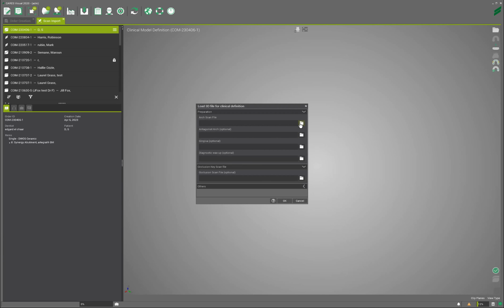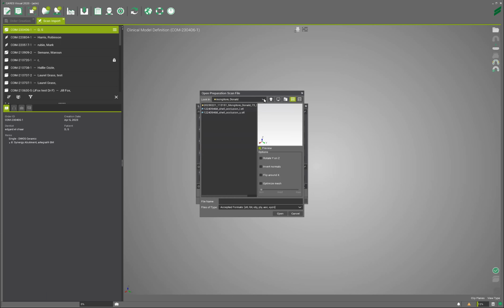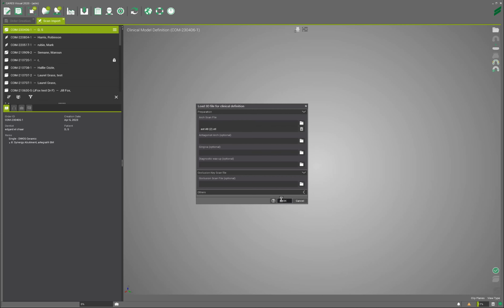And as I said, I'm going to try to do my best to cover the names, but it's not going to be easy, so forgive me about that. And I'm going to go for her file folder. And I am going to take this one. This is the one that I have already prepared on Meshmixer, and I open it, and that's about it.